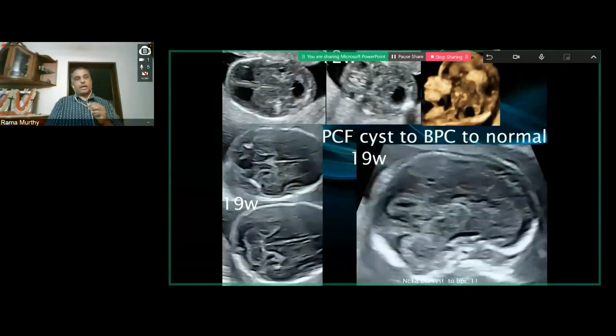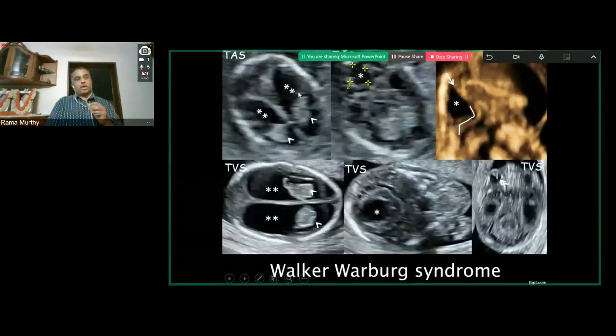Whereas in this particular case, this is the abdominal version. One look, you know that this is not the normal configuration of the choroid plexuses. They look small. They look rather bunched up. And who's taken their area? The fluid. The fluid has become a little more, and it's definitely eye-catching. There's no doubt about it.